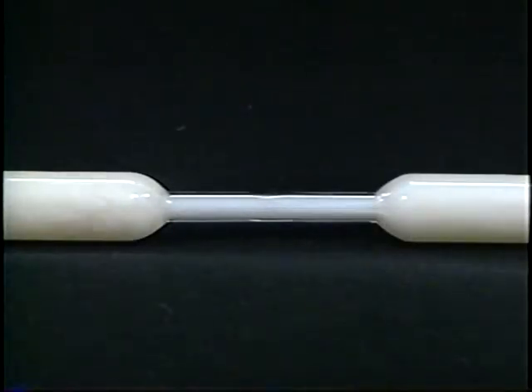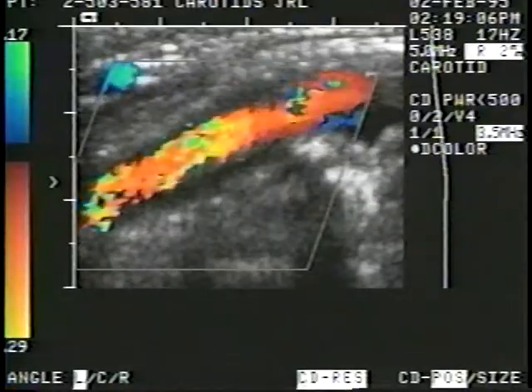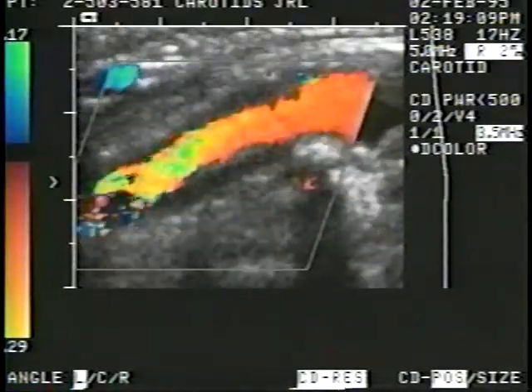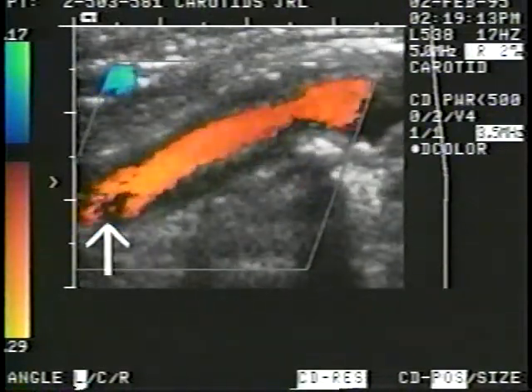Module 5 demonstrates entrance and exit effects in a long stenosis. The optimal flow rate setting is slow. In this segment, upon entering the stenosis, one will observe an initial funneling of the flow. Gradually, if the stenosis is long enough, laminar flow is reestablished. At the exit, there is a separation of the boundary layer and the fluid flows in a retrograde manner towards the region of lower pressure. This duplex Doppler segment demonstrates these flow characteristics within and at the exit of this long segment of narrowing.